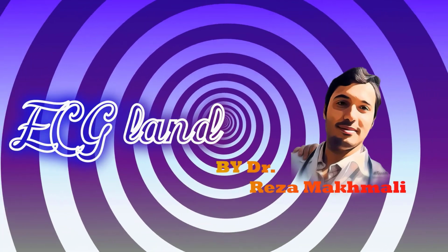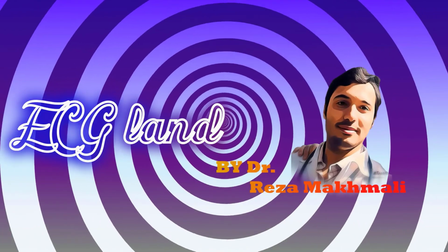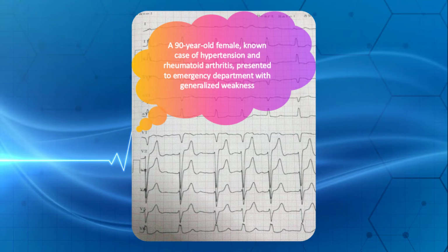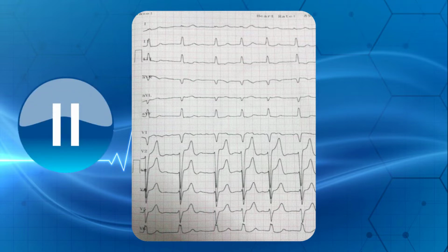Hi everyone. In the present episode, we have an EKG quiz. This electrocardiogram belongs to a 90-year-old female, known case of hypertension and rheumatoid arthritis, presented to emergency department with generalized weakness. What do you think about this EKG? What is your plan? Pause the video, and try it yourself. Then we go through the strip together.